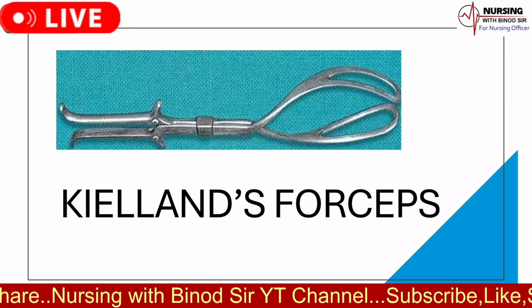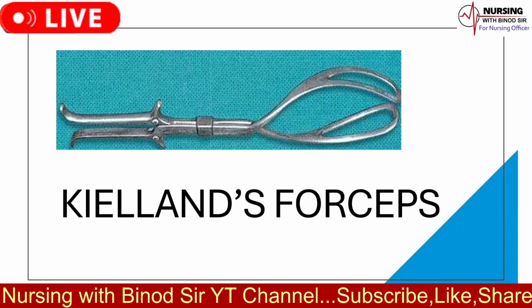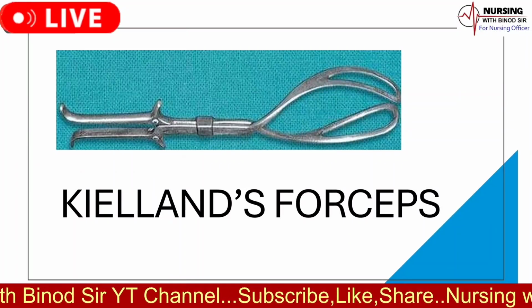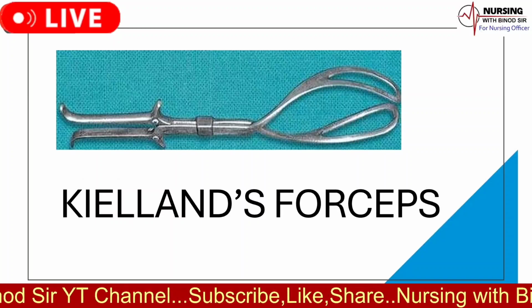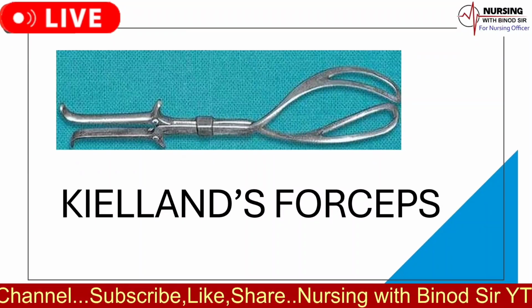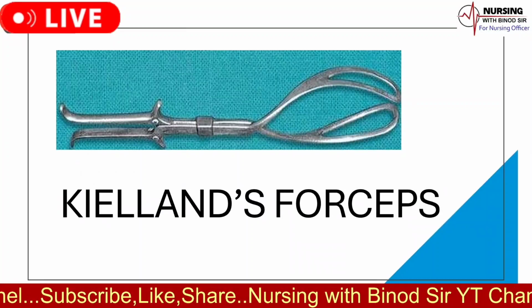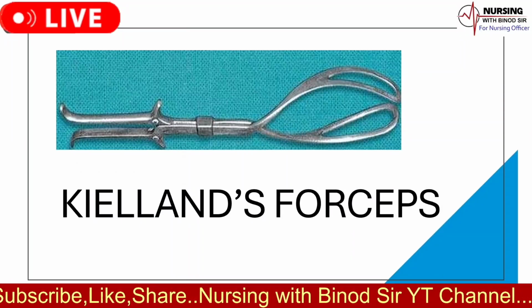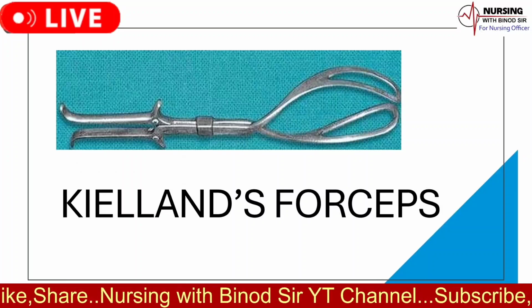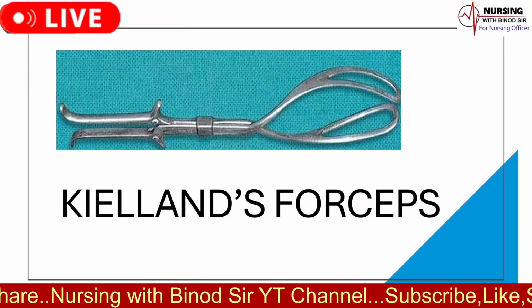By facilitating the successful rotation and delivery of the fetal head, they can reduce the need for caesarean sections, especially in fully dilated scenarios. 5. High station deliveries, used for deliveries where the fetal head is at a higher station and needs to be brought down. 6. Malpresentation, helps to correct malpresentation.